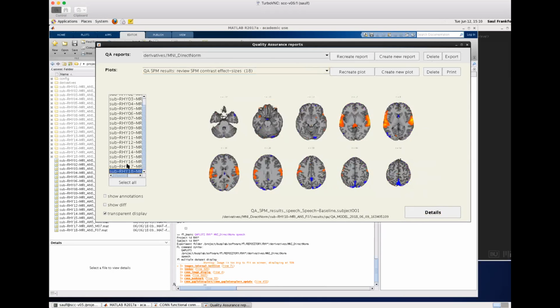Save these plots, and I would say try first adding the quadratic motion-related regressors for those two subjects. See whether it helps, and if it does help, even if only a little, try running the same thing on every subject and see whether you got a little bit of reduction for the few subjects that still show residual things that look like motion-related activation, even though they didn't have that much motion to begin with. See whether the additional introduction of second-order motion effects helped on those subjects as well.